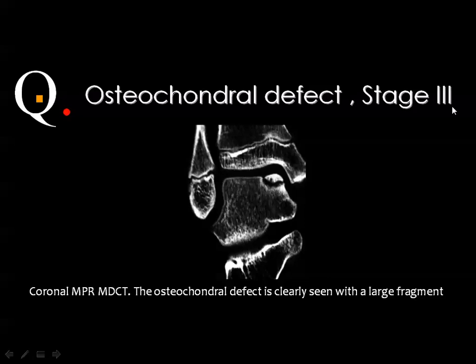This is the coronal reconstructed image of the CT, and this is stage gap. stage كام؟ 1 ولا 2 ولا 3 ولا 4؟ ملناش دعوة stable unstable. 3. الاثنين بيكون النيكروتيك بون is not yet separated from the talus. لما تبقى separated ما اتحركتش من مكانها هيبقى 3، لما تمشي من مكانها هيبقى 4. And this is stage 3.